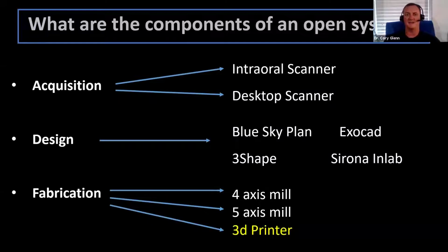So yeah, you're adding a step, but many people don't want to change a lot of aspects of their workflow, so this can be an excellent option. The end result of either is going to be the same. You're going to have STL files, which you can now take into your design software. Which brings us to design.